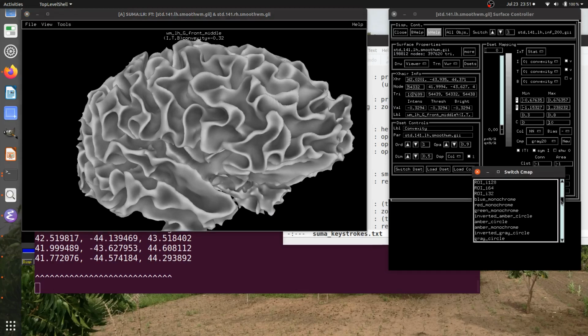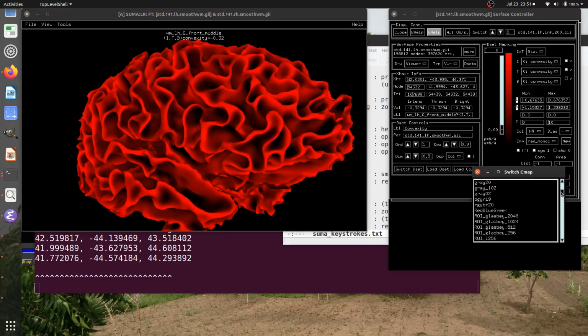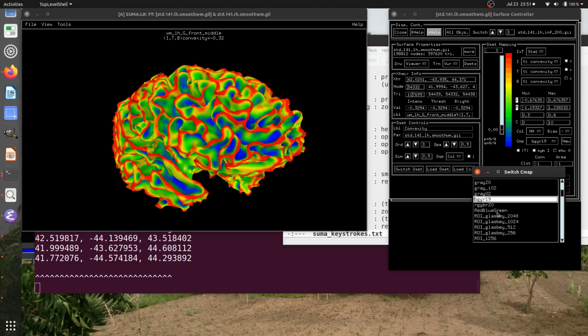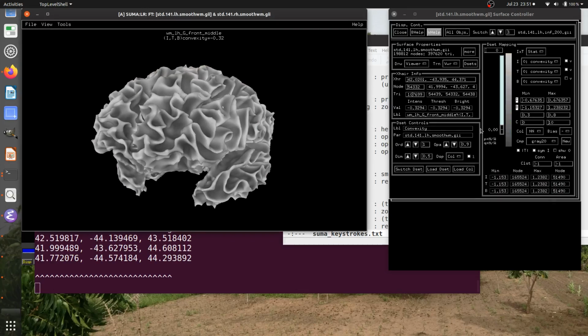If you want to, of course, there's colors. You can have an alien brain that looks kind of like a rose, I guess. Any color bar that's meaningful and useful. This one, maybe not so much here, but okay. I kind of like the gray 20. All right, so again, this CMP is color map.